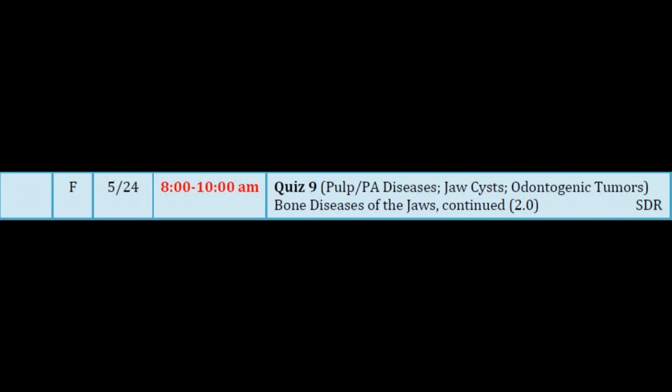What do we see in this patient? Lucent, opaque or mixed? Mixed. It's mixed. It's mostly lucent, but it's getting areas of opacity right in the middle. Once it's mixed, you should never think that it's of inflammatory origin. Those things that arise with non-vital teeth are never mixed. They're always pure lucent.